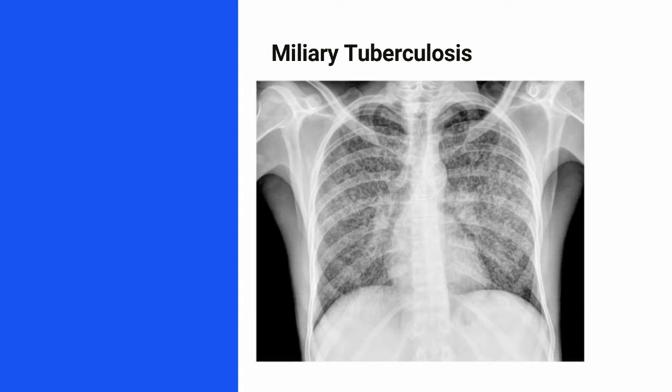And you have to match this chest X-ray with the clinical findings and the medical history of the patient to confirm the diagnosis. In case of miliary tuberculosis, there will be a chronic history of tuberculous infection. Primary lung cancer with hematogenous spread also depicts the same finding on a chest X-ray.